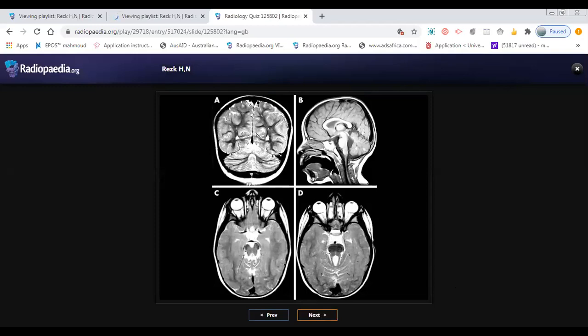Most of us like this molar tooth, so it's a lovely short case that can come to you and we can put some differential for you, but with this young patient and this appearance, you will consider it as molar tooth.